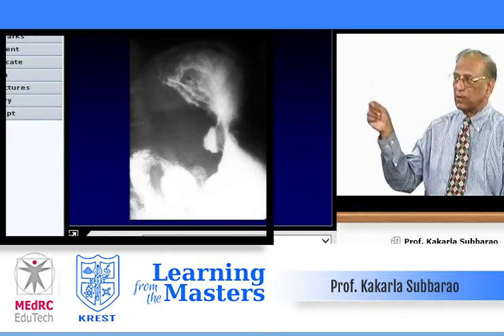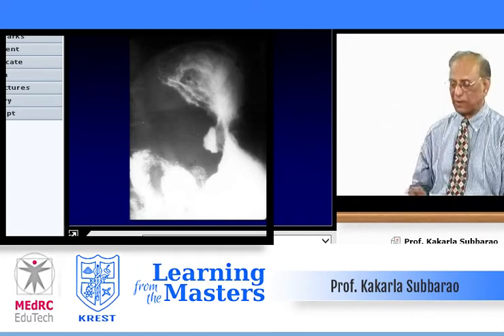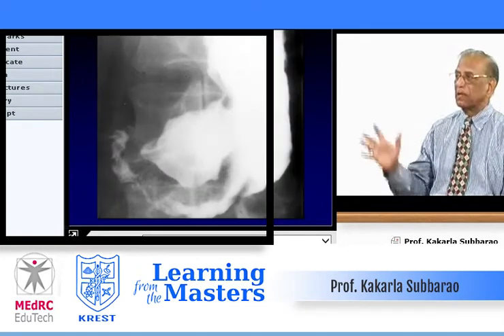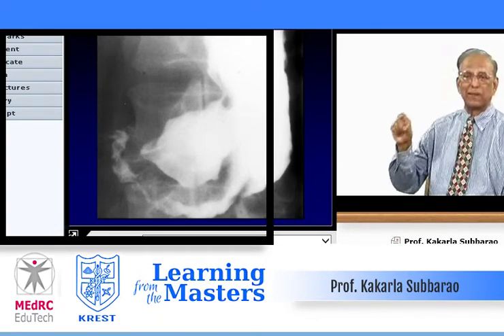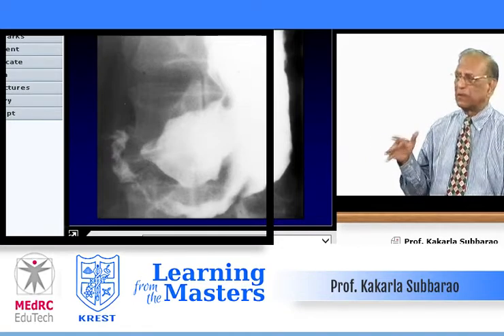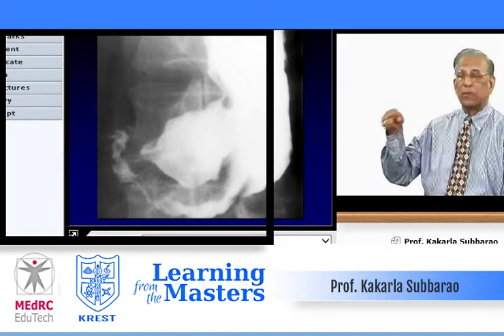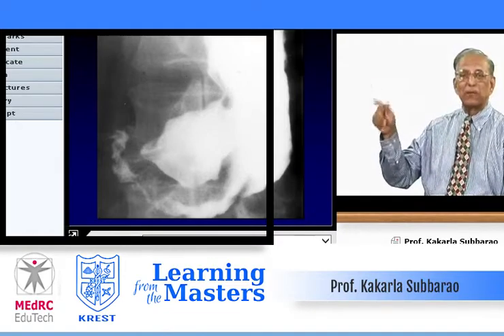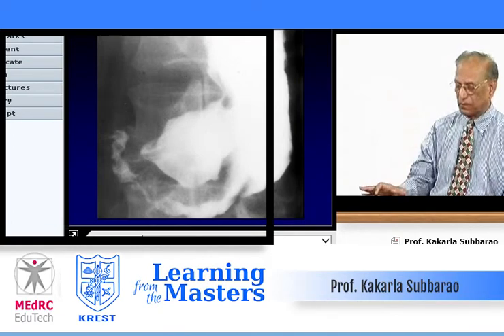The mucosal folds are going into the floor of the ulcer crater. That is important. Whereas in a malignant ulcer, look at the irregular, thick rind along the ulcer crater. And the ulcer is also huge. Benign ulcers, you can get large ulcers, but not this huge and with an irregular wall. And it is in the lumen with a mass, intraluminal, whereas the other one was going out into the wall.